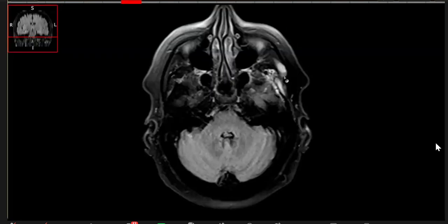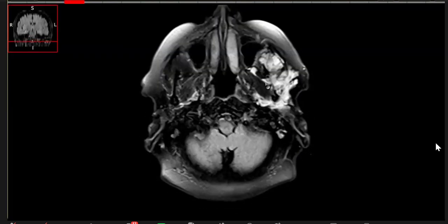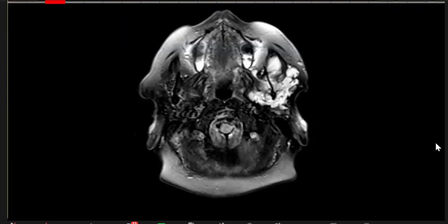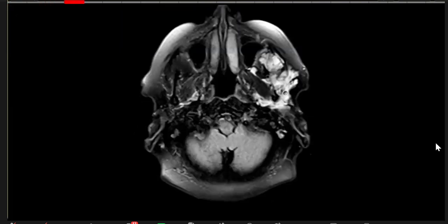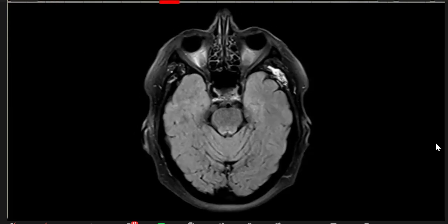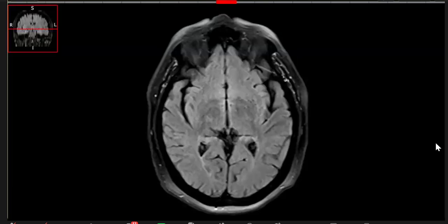So from there, anatomy is that this goes and touches the base of skull. Now there is a lesion which is infiltrating. It is transspatial. Transspatial means it is going into the masticator space, it is going into the bone, it is going into the parotid gland, and then it goes into not only the mandible but also the sphenoid bone.